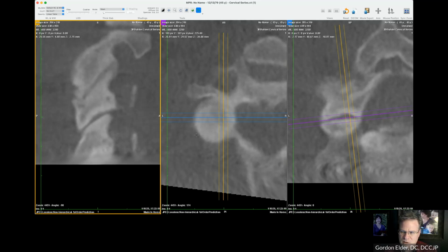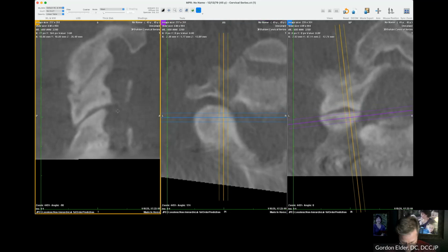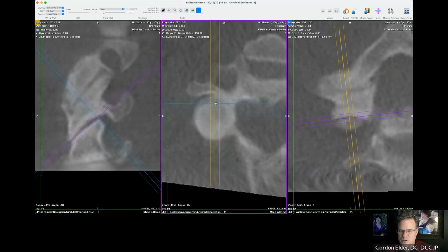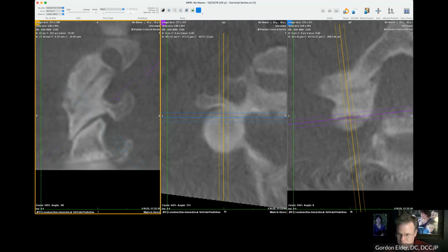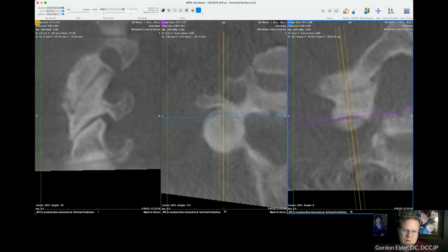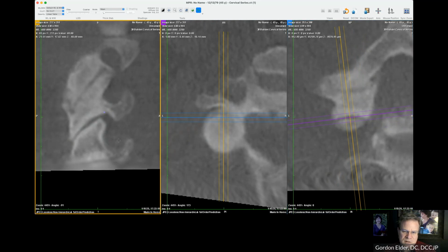Okay. We're getting medium. So really with the C2 on 3, what we want to see is this anterior margin, which is going to be way up here. We can wiggle this back and forth, and it looks like maybe here is part of it, and that would be anterior. So if we go through here and determine that that is actually the anterior margin of the joint, then it would have slipped up and forward in comparison to C3. We would call this an ALS. It's on the left side, anterior and superior.